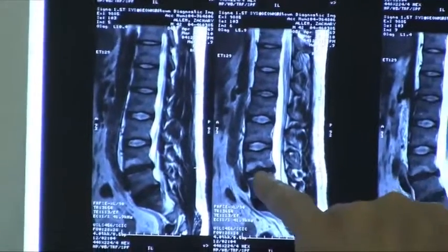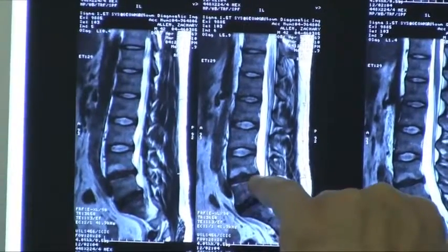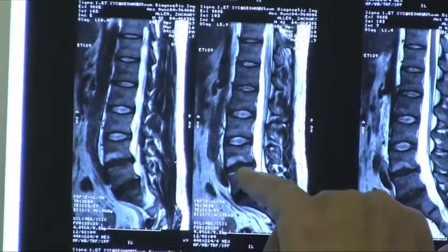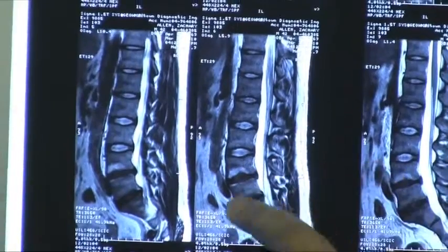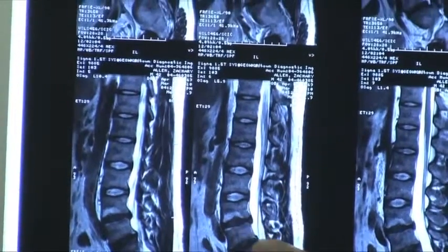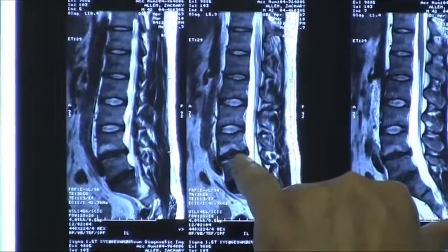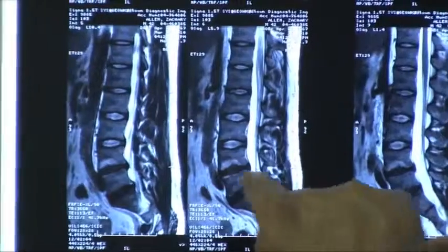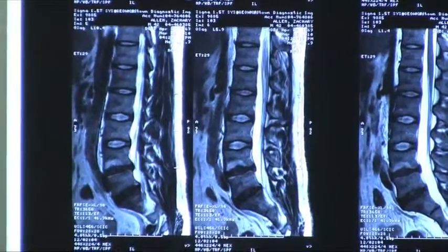So this particular vertebra has a deformity. Instead of having a nice flatter or smoothly curved end plate or bottom, it's got this sharp demarcation up into the body and down, that sharp, pointed, jagged area. That depicts a fracture of the end plate there, and as a result, that bone is not happy, it's swollen, and you notice that in the MRI scan.